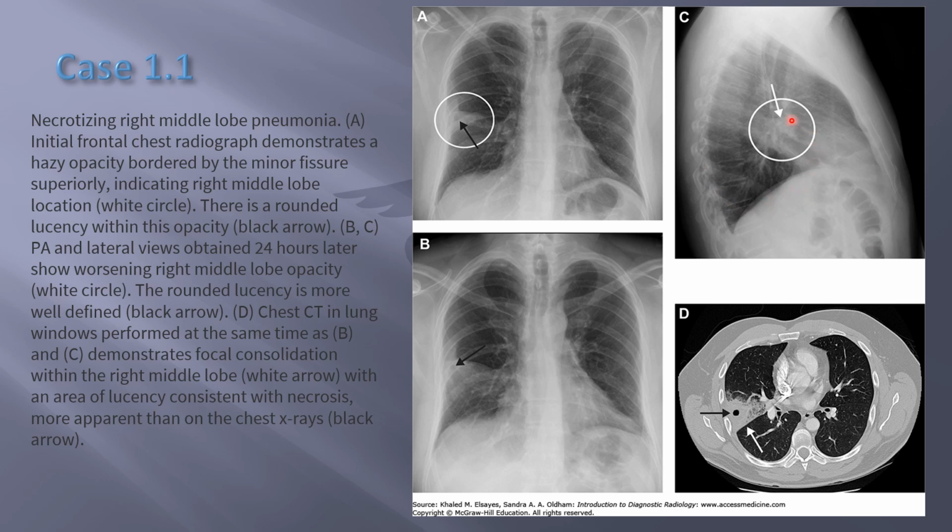And you see a little bit of a dark spot here. Right through that rib, you'll see a little dark spot in that same infiltrate here. And when they do a CAT scan, it's actually tissue that's super infected, super inflamed, and this organism is actually causing necrosis of the tissue here. So the tissue is dying and creating a little void, and it's a necrotizing type of organism. So you can actually see that on the X-ray there. So that's just another example of a pneumonia.